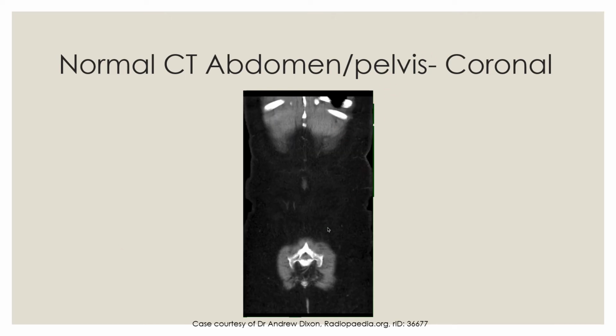And let me just remind you of our laterality. Left of the screen is right of the patient and right of the screen is left of the patient. We have our kidneys. We have our vertebral bodies. We have some of the pelvic bones here.